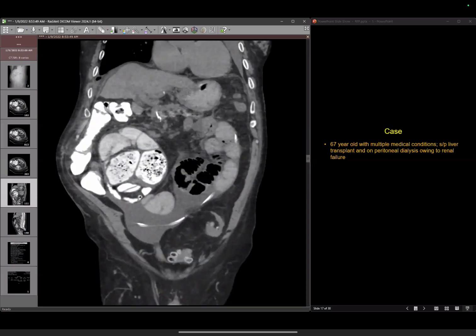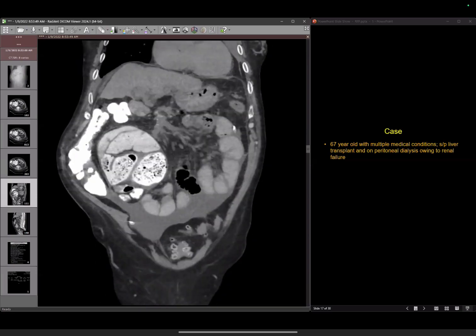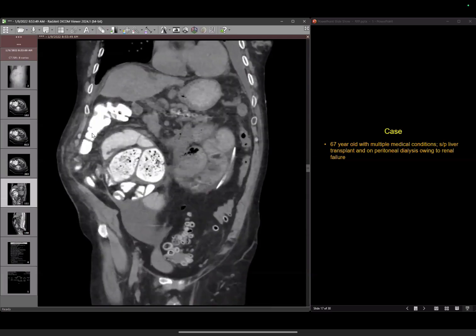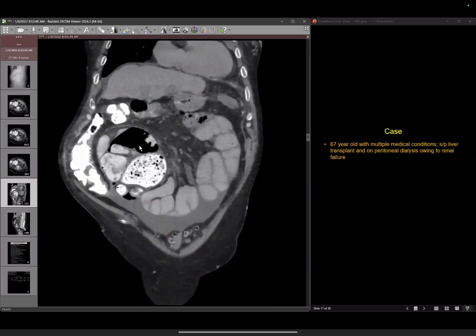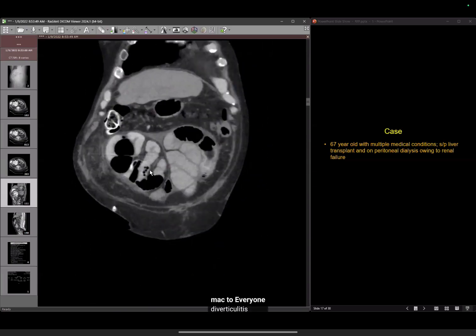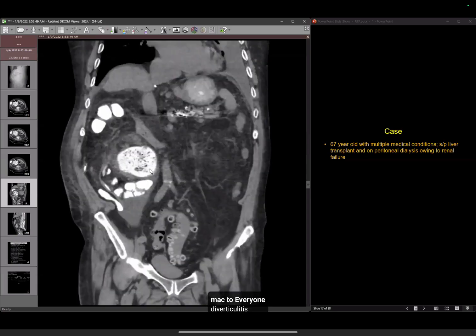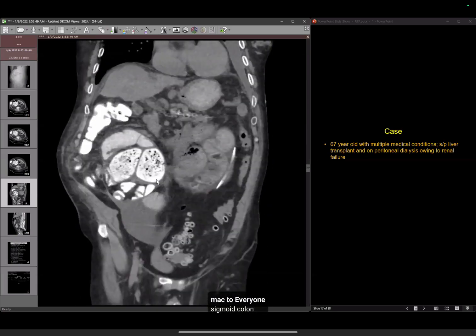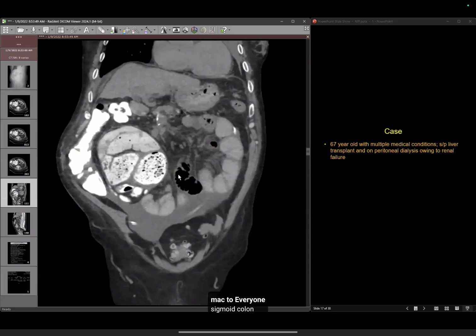So that means even though there is slow transit, you rightly pointed out there appears to be small bowel feces sign, but contrast is still making its way into the large bowel. So that is because of increased transit time. There is small bowel feces, but it is going distally. Yes, sir. So there is no mechanical obstruction here. Okay, so we rule that out.